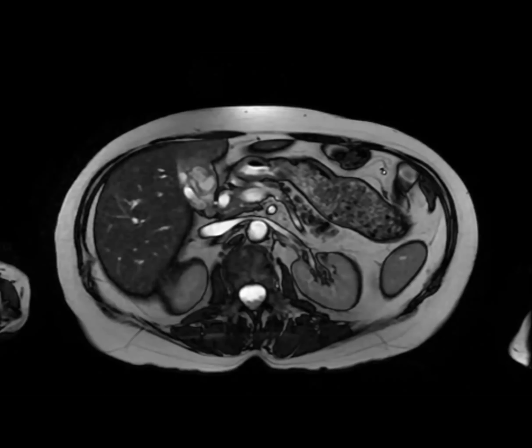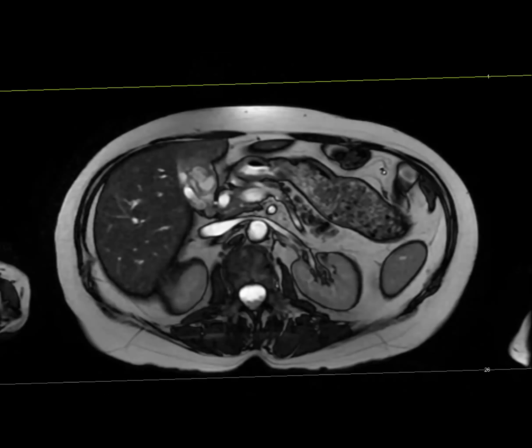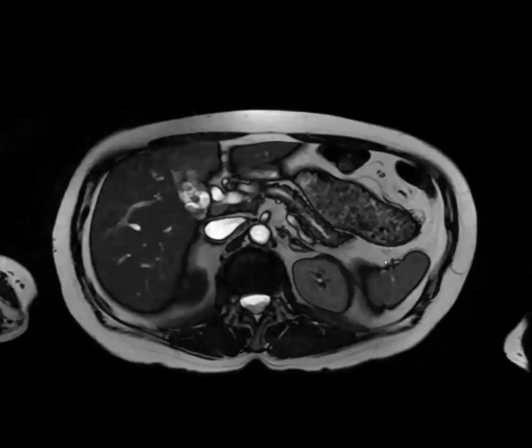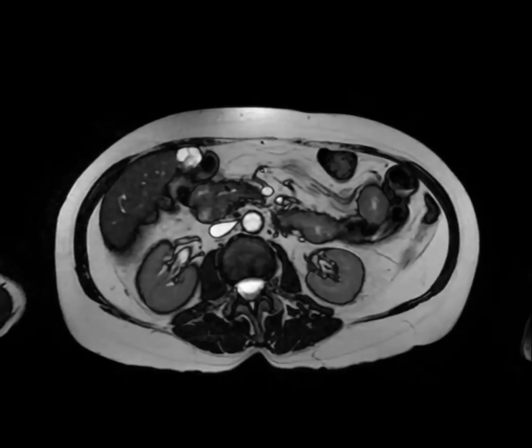Let me see. I can't show you the report, although I would give kudos. But yes: worsening gallbladder wall thickening with mucosal hypertrophy of the gallbladder, with concretions within the gallbladder wall and enhancement of the adjacent liver parenchyma. The constellation is suspicious for xanthogranulomatous cholecystitis versus adenomyomatosis with superinfection, which is basically what it is. Cool. Diagnosis of the year. That's great.